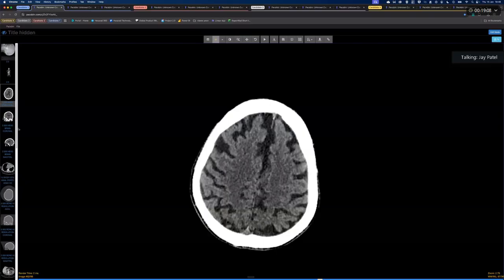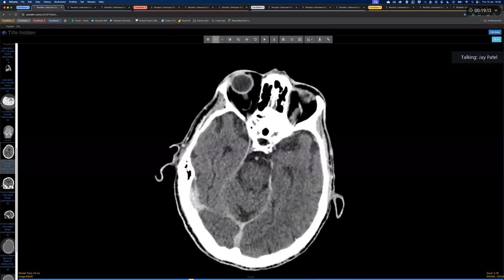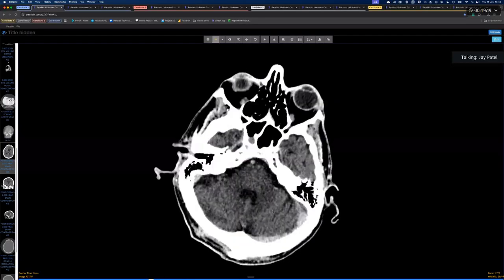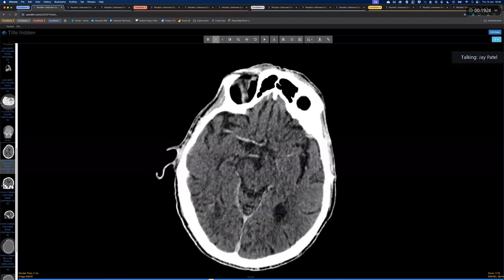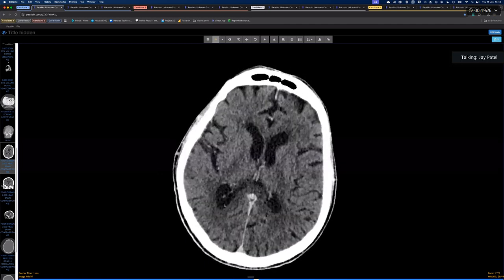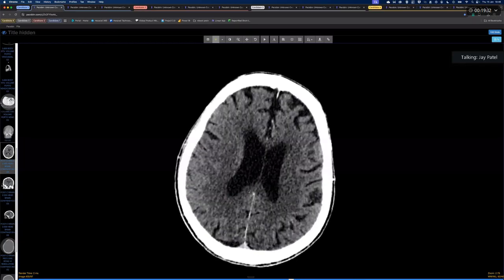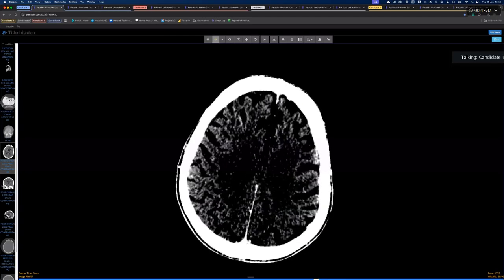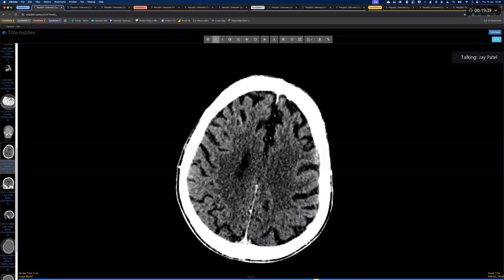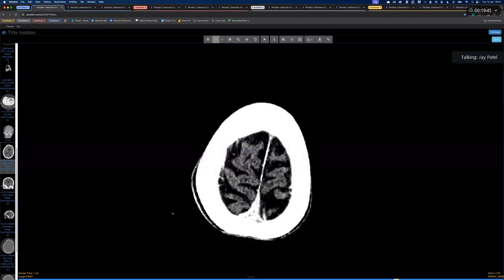And you came up with two very sensible suggestions, which were an MRI and a CT. And if we go back to the CT, post-contrast, it's one of those cases where the more you see, the more metastases you can spot dotted around all over the place. Like I said to you at the outset, this is a hard case, but the intentionality is not necessarily about finding the images, but it's a storytelling piece.